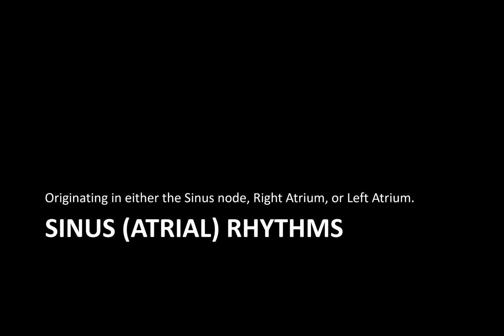Finally, after all of that, the A&P, the electrophys, how to put leads on, how to read them, how to analyze, let's actually finally look at some rhythms, huh? Well, we're going to start from the top of the heart working down. So we're going to do sinus or atrial rhythms. So that's going to be ones coming from the sinus node, the right atrium, or the left atrium. I'm not really going to specify one or the other than sinus node beats. Just realize that atrial rhythms could come from any one of these locations.